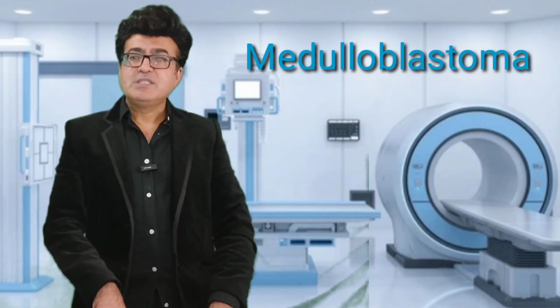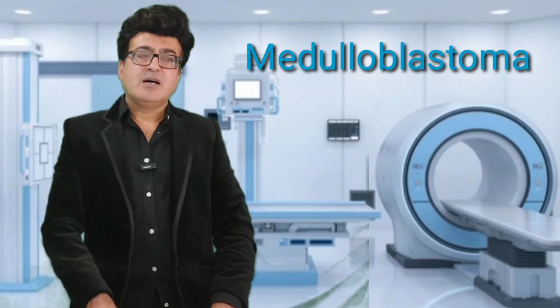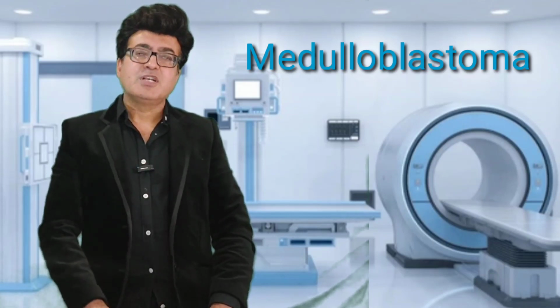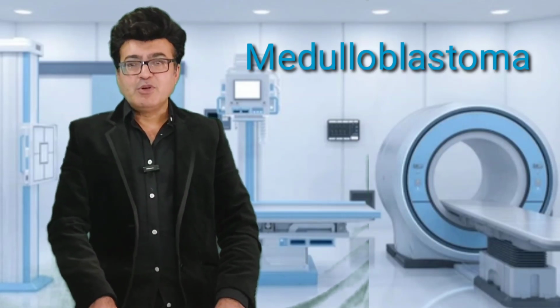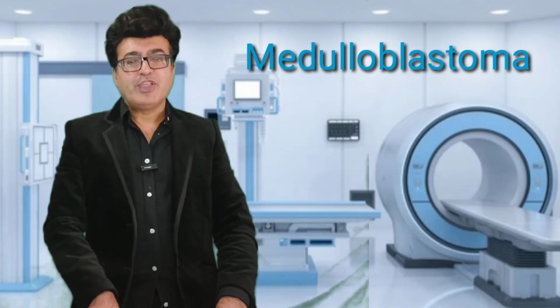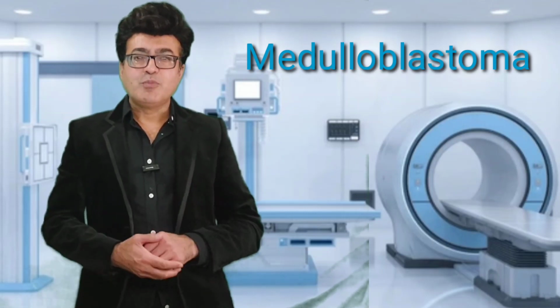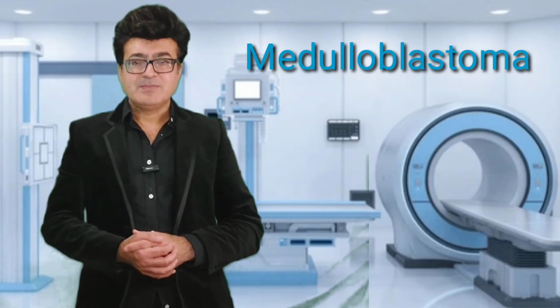At the time of presentation, one-third of the cases present with intracranial dissemination, intraspinal dissemination, and even subarachnoid dissemination. How we will be able to appreciate it on the non-contrast CT images and on the MR. So this video will particularly cover all this information, and I do hope you will love it. Let's start watching these images.